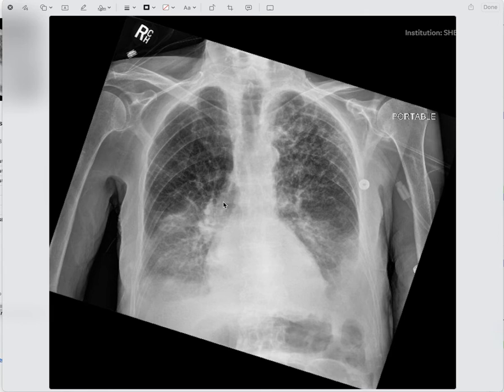And so I did a thoracentesis on him, both for diagnostic as well as palliative, because it was affecting his breathing, he's dyspneic, and sats were going down, etc. But if you look at this chest x-ray here, which is what we're kind of focusing on, obviously.